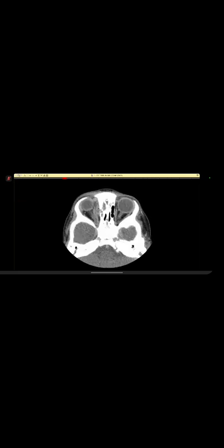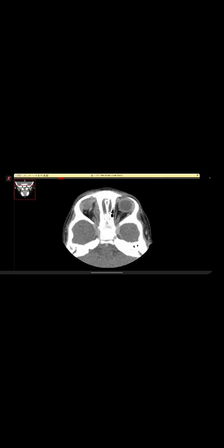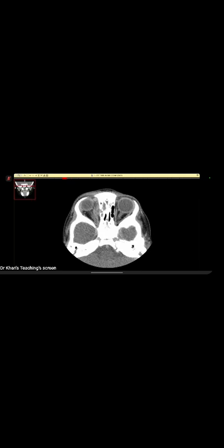Ask for contrast, and now there is an inflammatory phlegmon which is sitting here. Look at the medial rectus. One can argue that it is thick and it is also enhancing. Now you can see the bony defect very well where I am pointing out, and there is preseptal extension, etc. Description wise, you have to be more elaborative for the examiner to give you full marks.